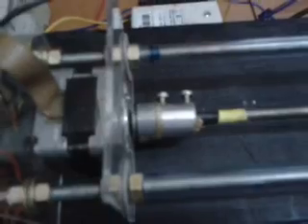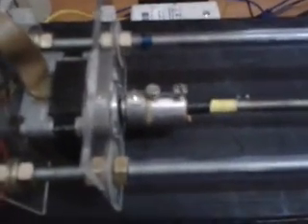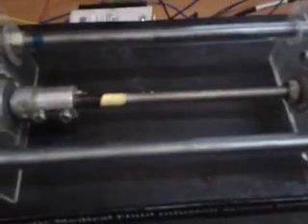So here, depending on both the temperature and pulse rate, the medical personnel can decide the amount of fluid to be infused. Four standard values are provided: 0.4 ml, 0.2, 0.1 and 0.05 ml, and this indicates the amount of time for which the selected volume has to be infused. So once infusion is pressed, this shows the infusion system is now working.